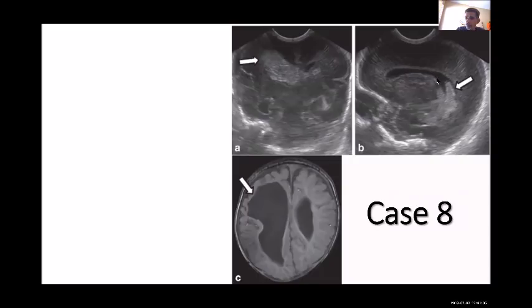Irregularity of the caudothalamic groove on ultrasound of a neonate, of course, this is my specialty, that means IVH grade 1. But you can see that there is extra choroid-like material inside the ventricle, with increased density. The other side, the lateral ventricle, looks normal with fluid inside it. There is an interhemispheric fissure, which is not yet displaced.